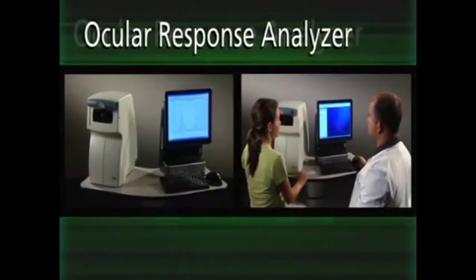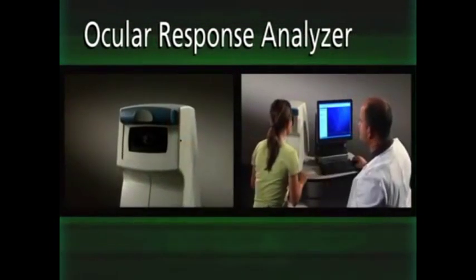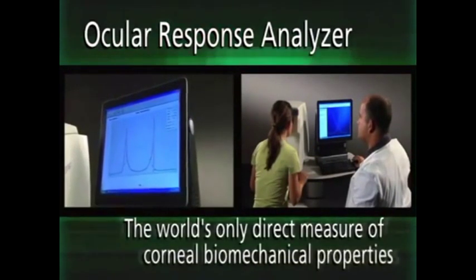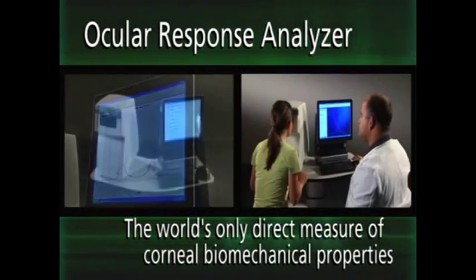The Reichert Ocular Response Analyzer utilizes a patented dynamic bidirectional applanation process to present the world's only direct measure of corneal biomechanical properties and a more accurate assessment of intraocular pressure.